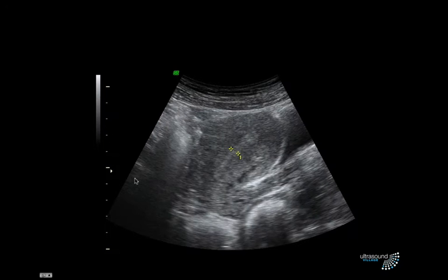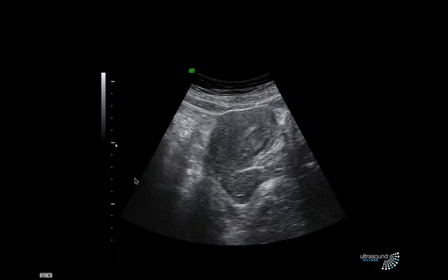Okay, now it all makes sense. Now you might think that that's just a one-off, but here's another case, the same thing. Empty bladder, the uterus sits anteverted, usually, cervix here, vagina here. This time you don't see the bladder at all, just the bladder wall, it's so empty. Anterior abdominal wall, bowel gas. Rectum behind the vagina here.